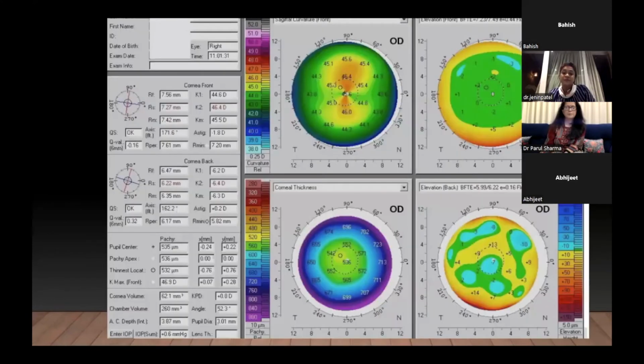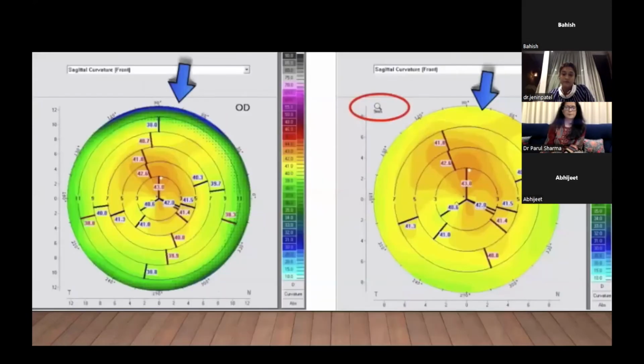So what is the area which is allowed, that this much would be acceptable and I would go with this map, versus this area is extrapolated, let's say around 10% or 20% or 30%? What is the cutoff for the extrapolated data?